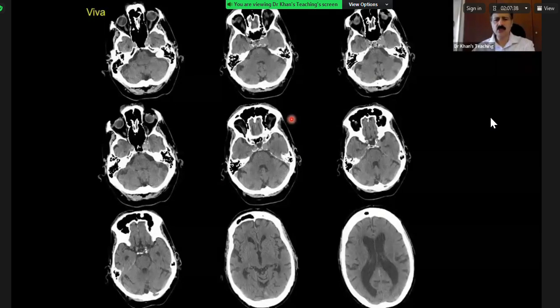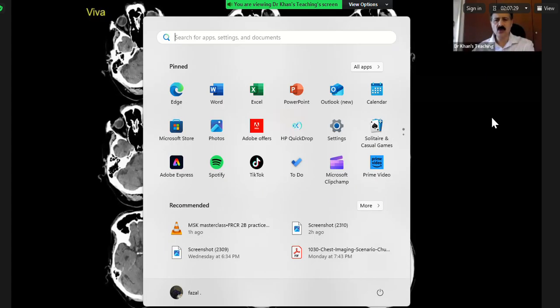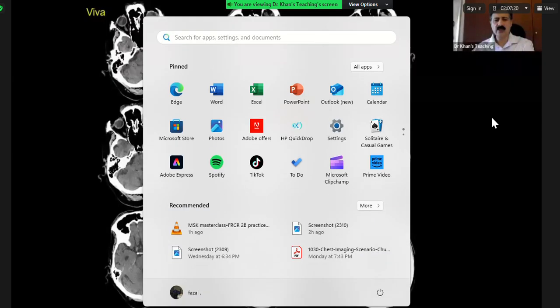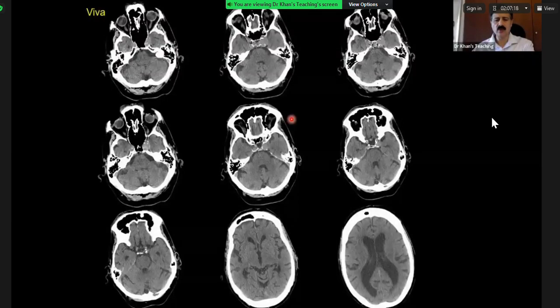So if you see here, now, this is what will happen. Last time, if you remember, I showed you 4 or 5 cases of pituitary adenomas. And those pituitary adenomas, some of them were extending into the cavernous sinus or the sphenoid sinus, etc. The examiner is always going to show it to you on an axial sequence. And in the tension of the exam, you are looking at the whole of the brain, and actually the problem is here. Again, an edge of film type of a case for me. So if you see here, there was expansion, at least something is visible.